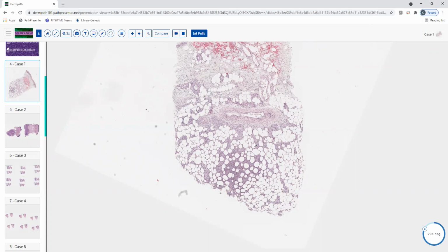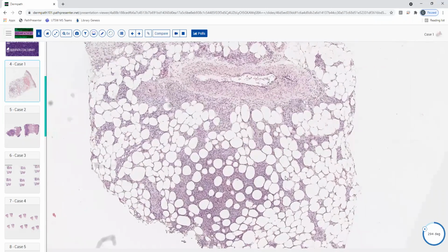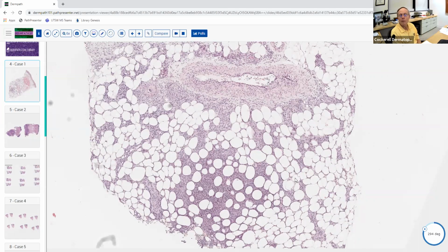You could think of a lupus panniculitis, but you would expect to see some additional perivascular inflammation higher up in the dermis. And then you could think of a pancreatic panniculitis. Those are kind of the top ones, and subcutaneous T-cell lymphoma would be another one as well. Yeah, good. Exactly. Those are things you would look for. Or an infectious panniculitis. Those can be mostly lobular panniculitis, but none of those really make a lot of sense here.